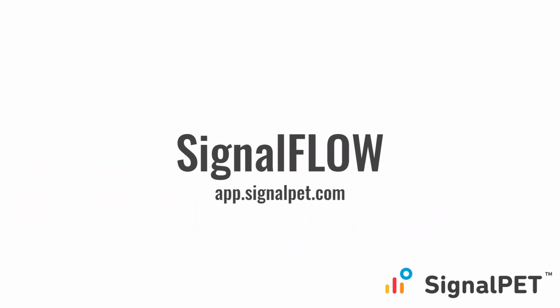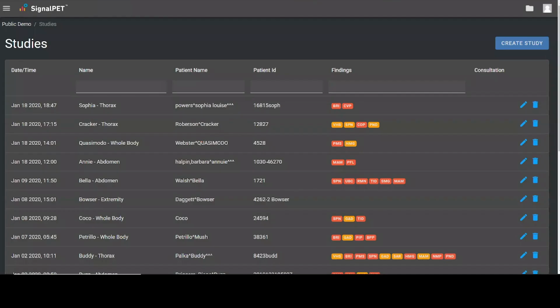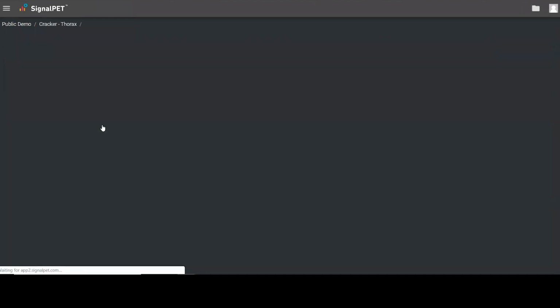All right, let's see. I'm going to move on to SignalFlow now. Another question you might have is, okay, I have a parenchymal pattern, but what do I do with that information? If you were on SignalPET, this is kind of what you would see. You'd have your company name up here and then your list of patients and whatever findings were there for each patient. We're going to look at Cracker's radiographs.